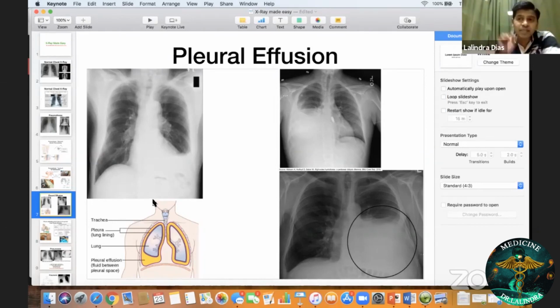So what is the first place where you will notice pleural effusion? Guys, in the lungs, air usually stays in the upper part. Why? Air is very light, but water will go down in the thoracic cage. So if you have a pleural effusion, it first starts in the bottom of the lung field. What is that place called? Costophrenic angle. Here, this angle.